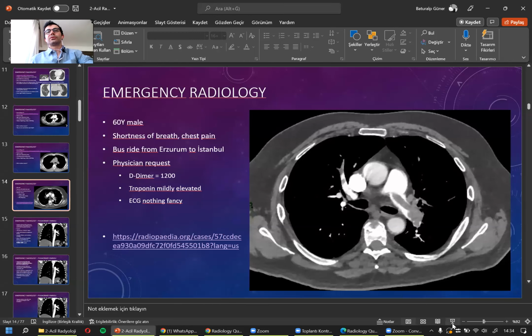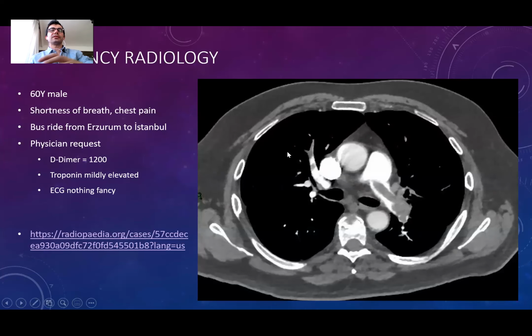Okay. So we have been covering the case of pulmonary emboli before, so I'm going on to the next one. We were talking about how the thrombi are taking the exact shape of the blood vessels they are coming from. Because these thrombi are probably coming from the femoral veins, they look like a venous structure, right?